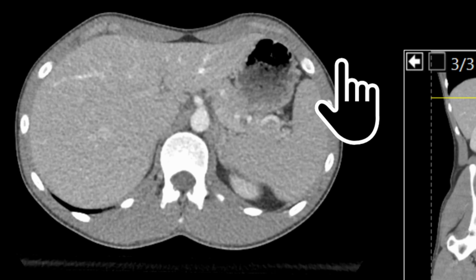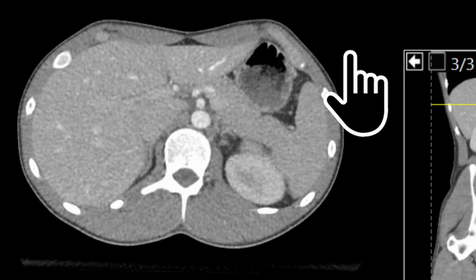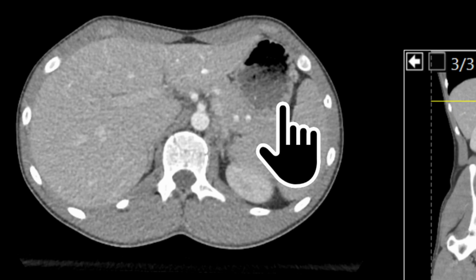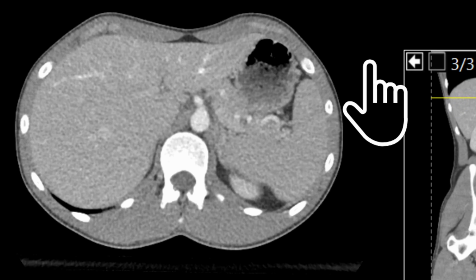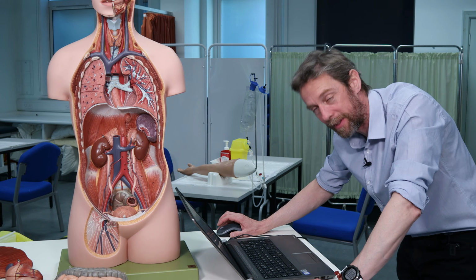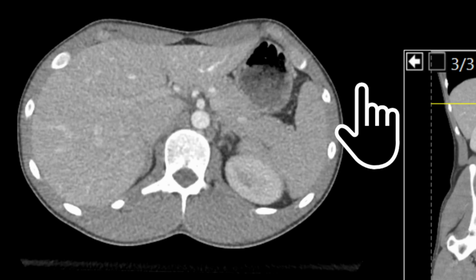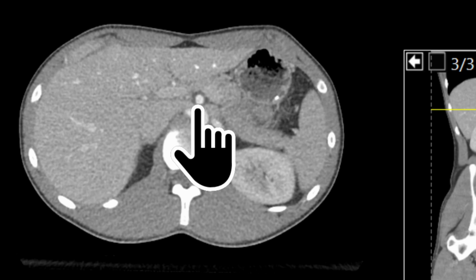And then the second branch is not very far away. It's just a few sections down. And that's what we see here. So there's the first branch. Scrolling down, there's the second branch. So this is the superior mesenteric artery. How can I possibly be so confident that that's the superior mesenteric artery? Well, if we keep scrolling down, I see this thing going whoosh across here.